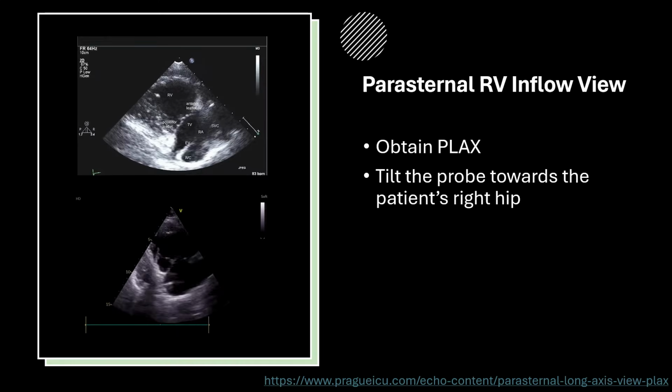In this particular window, you want to assess the right ventricular function, motion of the tricuspid valve and its leaflets. You want to assess the tricuspid regurgitation with color flow Doppler. We'll talk more about color flow Doppler in the next lecture. Also pay attention for the presence of possible right atrial masses, right ventricular masses, and clots within the right atrium and right ventricle. Please pause the video if you need to review this slide in more detail.